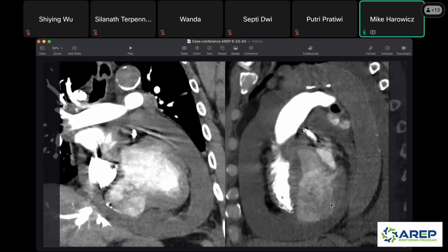And just to take a step back from that, with dedicated cardiac planes, you can reformat all these different views of the heart. Cardiologists do it pretty often with echo. We'll talk about a 4-chamber view, 3-chamber view, 2-chamber view. If you're not familiar with that, that's okay. Just know that there are different ways that you can make the heart look with multiplanar reformats to get different views of the heart. And if you don't know how to do that, I would just look at the coronal and the sagittal because it's a pretty good start.